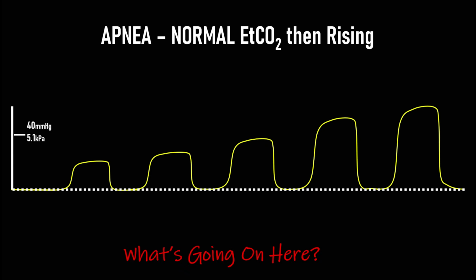During apnea, there is widespread atelectasis and airway closure. When the ventilator starts, some lung units do not participate in ventilation but gradually open and release CO2. Let me illustrate this.